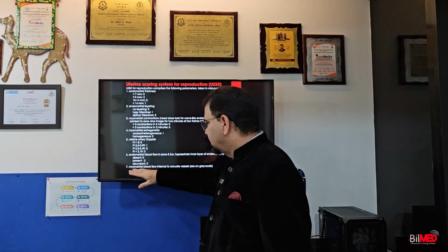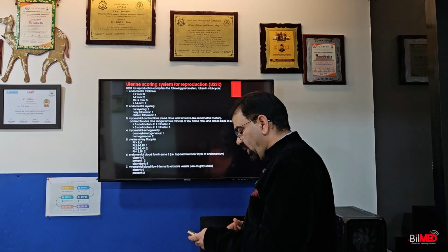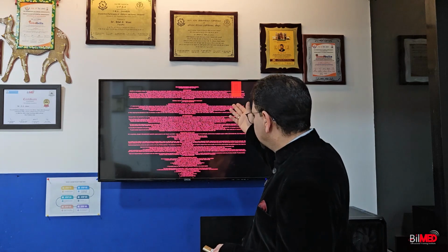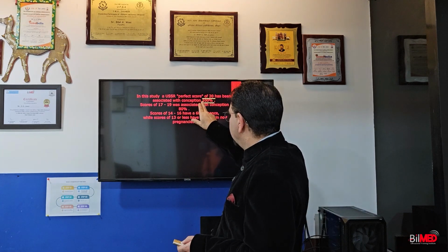And lastly, see for this, myometrial blood flow to the internal vessels, internal arcuate vessels, and give the points accordingly. Then there was a long study which was conducted. I am giving you a summary of this long study. In that study, a perfect score of 20, if everything was absolutely normal, the conception was 100%.